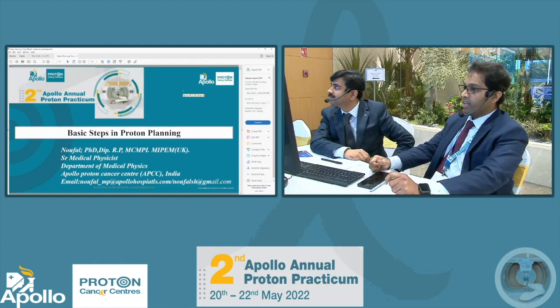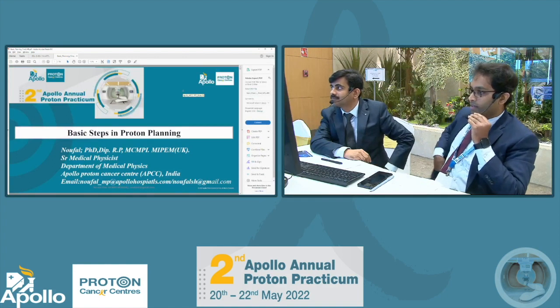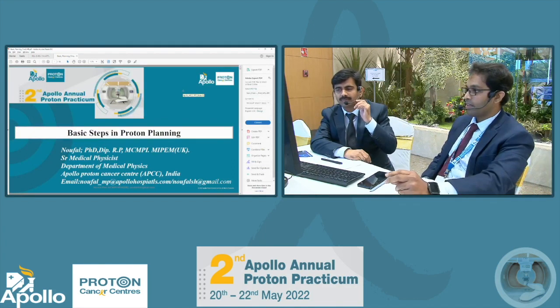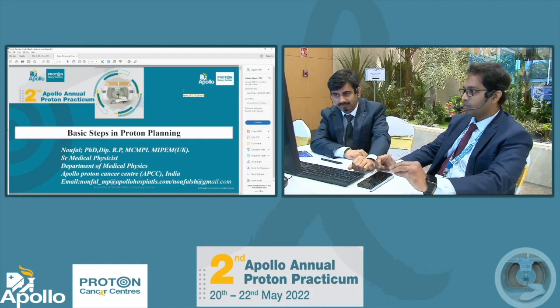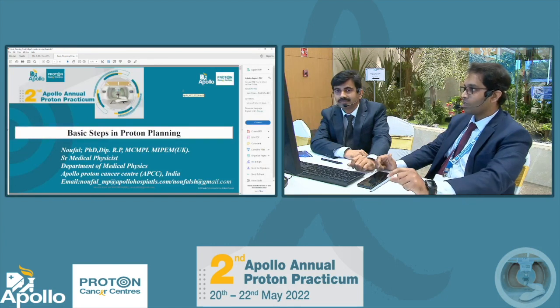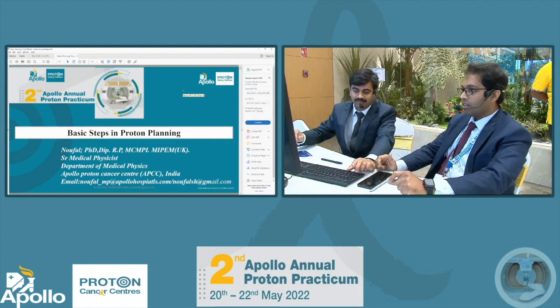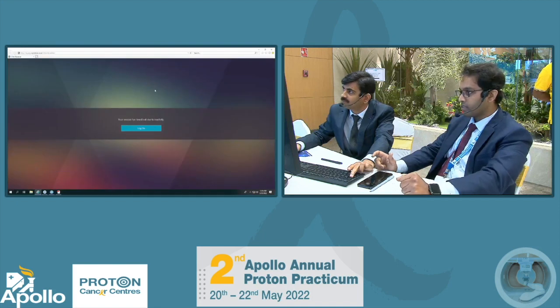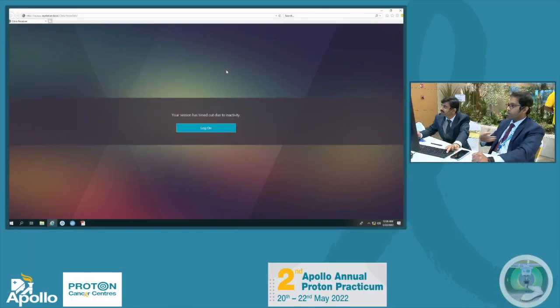So I think in the last 2 hours you had a facility tour and immobilization procedure, and everything in detail. So once the CT simulation is done, all the images will be exported to our treatment planning system. We have RayStation as the treatment planning system, and we import all the images into it. And after importing, our work is delineation of the targets.